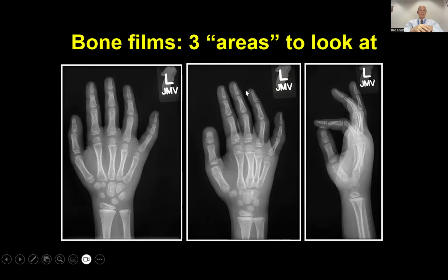Now, the final thing for the 5-4-3 rule are the extremity examinations. And when you think about it, chest, abdomen, and extremity examinations constitute about 99% of all the X-rays we do. So if you remember the 5-4-3 rule and those things which you need to look for and at, I think it will be helpful in your looking at films over the future.